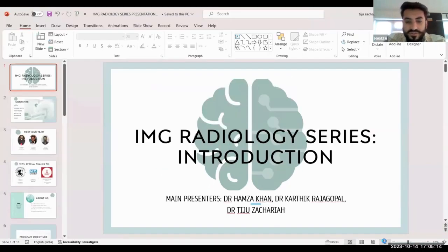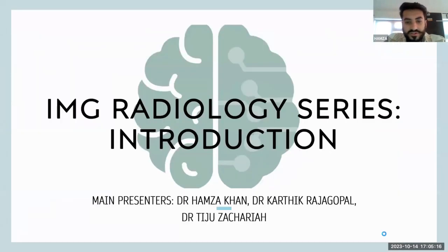So I'm here today with two of my colleagues, Dr. Karthik and Dr. Tiju, and we're going to be talking through a couple of basic principles of interpretation in radiology. This is our first series, so we're going to take it step by step, essentially.